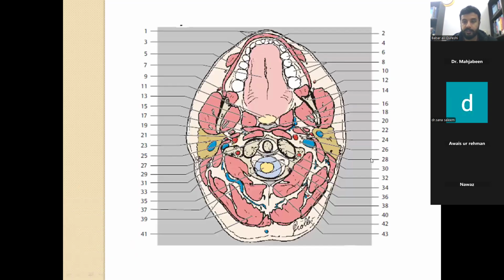Okay, coming to the axial view, in the same way, we need to appreciate a few things. This is a very complicated and busy slide, but usually in radiology, we get specific cuts of the spine just like this. Sorry, let me draw it again.